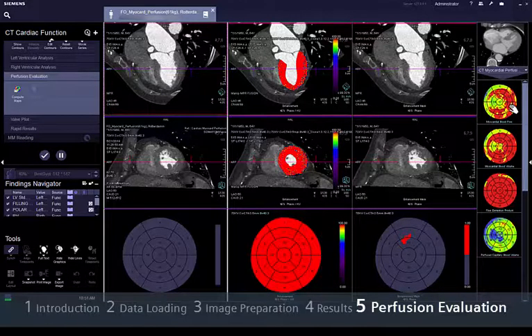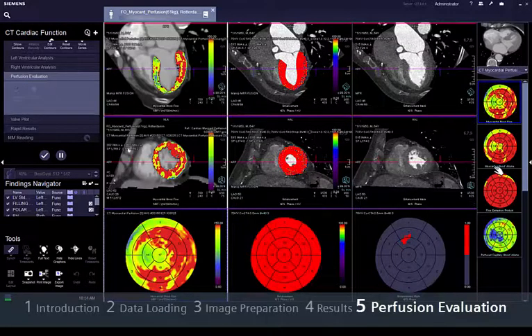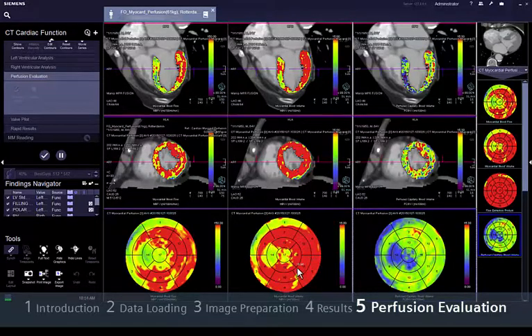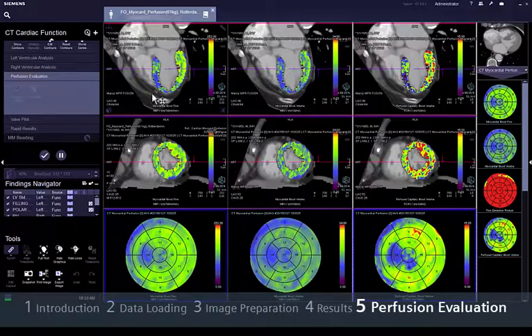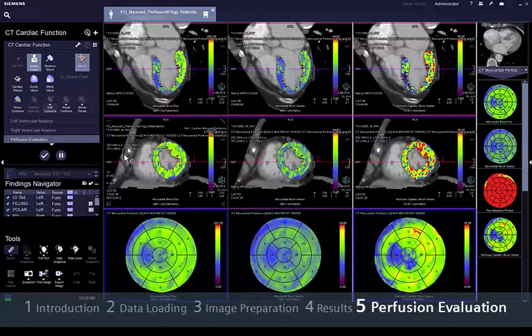The anatomical image will appear as a thumbnail, and all the results available will be displayed in the result gallery as polar maps. Drag the corresponding result to one of the 3 volumes of the layout. Proceed similarly to the rest of the evaluations to compare. The polar plot visualization and the direct overlay in short axis and long axis views help to pinpoint the perfusion defect. All results are conveniently collected in a report.